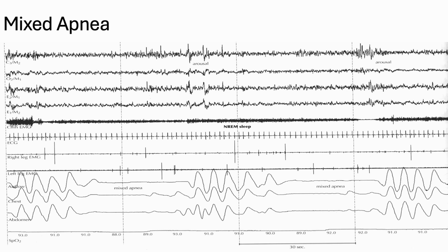These are different. There are different reasons for mixed apneas, but we can't really nail it all down. I've seen it the most when I have a patient on CPAP and they're over-titrated, or I've given them too much pressure. Too much pressure induces central apneas.